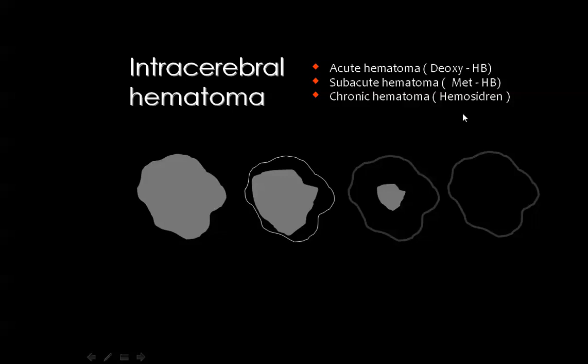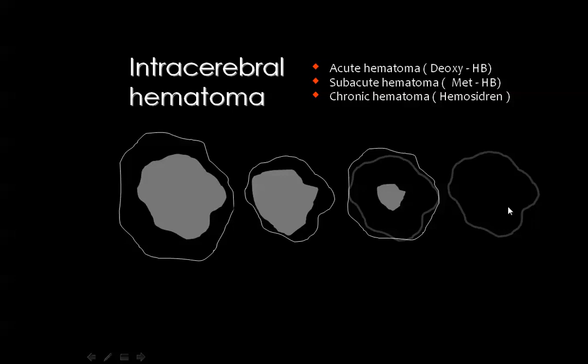And the appearance of hematoma on MRI is quite different from its appearance on the CT scan. But please remember that whenever the hematoma is formed, and you have seen the hematoma on MRI, the hematoma will change rapidly from the acute phase to the subacute phase to the chronic phase. And the change is usually from the periphery towards the center. Then, each hematoma is surrounded by some degree of perifocal brain edema, and the edema is usually little in the old stages of the hematoma itself.